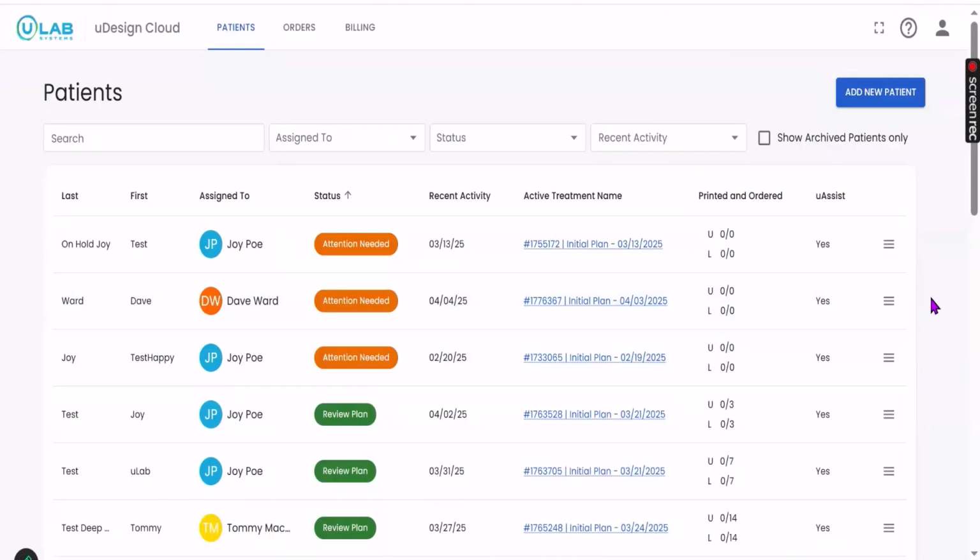In this video, we will review how to submit a new case to uAssist. Prior to submitting your case, we advise that you have your patient records available to upload. This will include your STL files, patient photos, and x-rays.